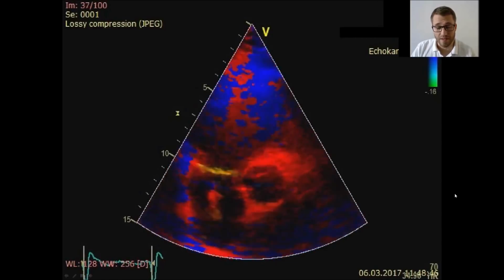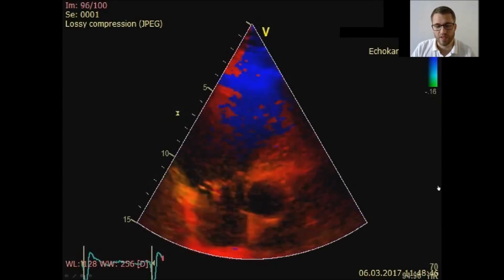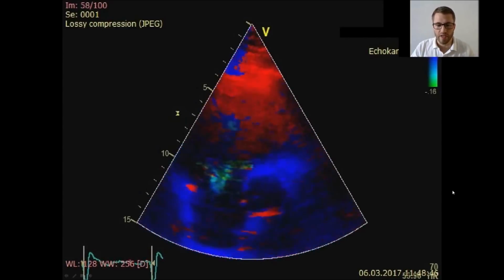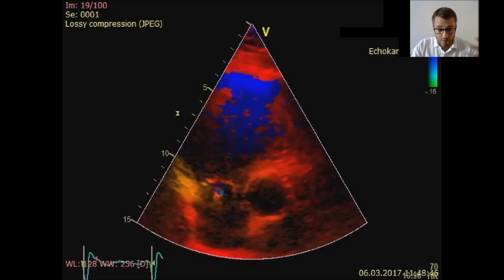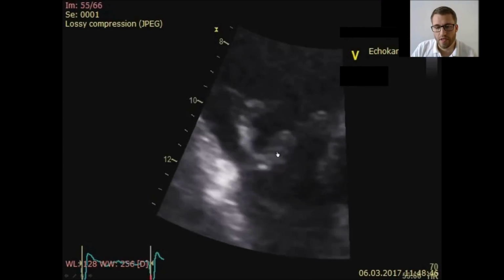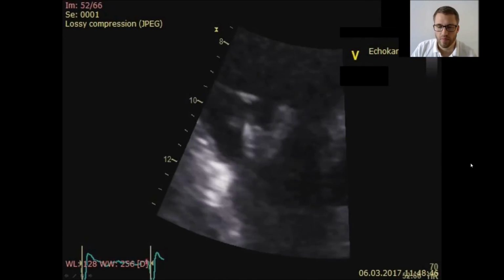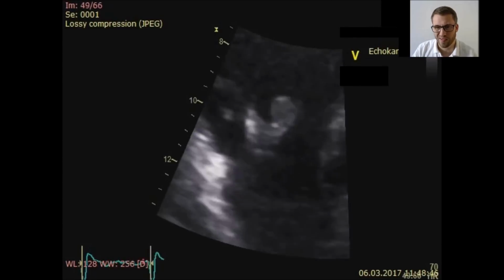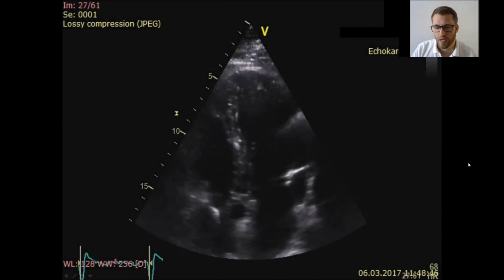And I think it's an amazing picture where you see this structure with a totally different color while all the structures in the heart are moving. This is moving in a totally different direction, and it screams at us that it doesn't belong there. And here's another zoom picture, so a very big structure here. Probably on the tricuspid valve in this view, but not sure at all where it originates from.